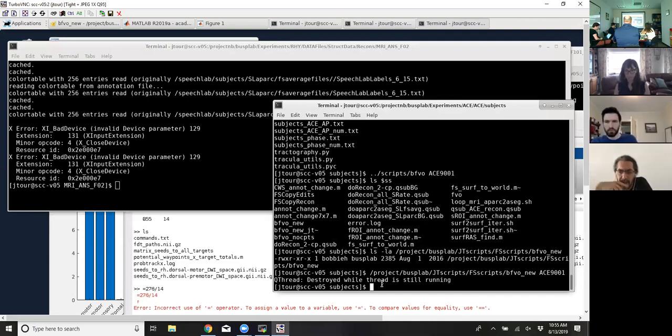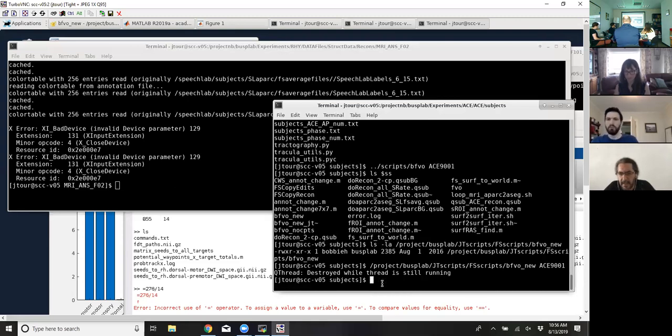Yeah. So we can table that for now, and in the notes of how to use this, I'll include that. Yeah, I think the dollar command is automatically translated, so I don't know, try with double quotes or something like that, just to make sure that the translation happens. It doesn't try to interpret it as a single. So try it with double quotes, then dollar SS.